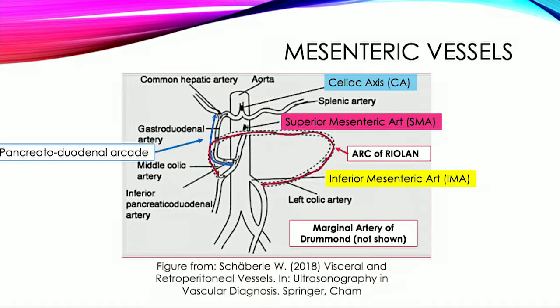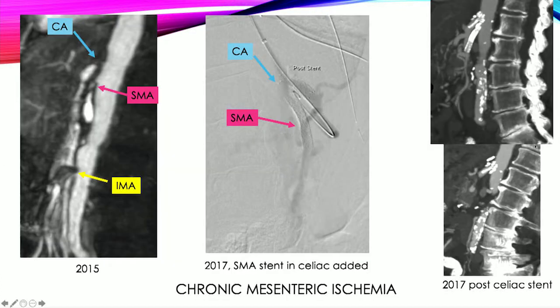Sometimes it may be difficult to appreciate at first that a vessel is occluded or compromised, but the presence of collaterals may remind you to look at the vessels and find the abnormality, even if a patient is not having a dedicated angiogram. This is an example of a patient who has multivessel disease. Compromising one vessel may not cause symptoms; compromising two vessels starts to cause symptoms. This patient has a lot of irregularity and severe stenoses in the celiac and SMA. The IMA is probably their best shot of getting flow to the bowel.